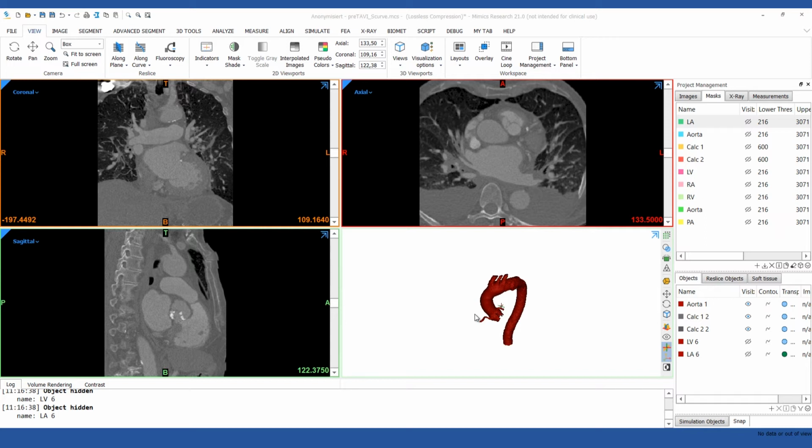The fluoroscopy projections used in the clinical setting are the left and right anterior oblique views and cranial and caudal angulation. The S-curve is made by plotting the values of the cranial and caudal angles for step changes in the LAO and RAO angles, which results in viewing the native valve plane on edge or as a line.